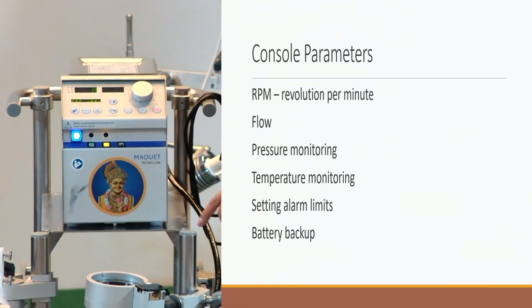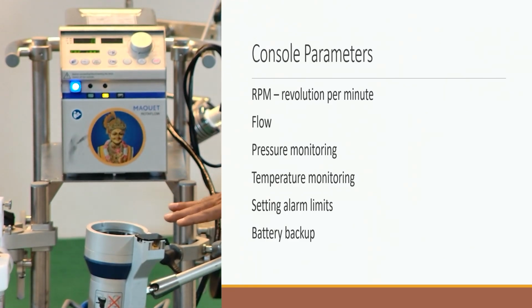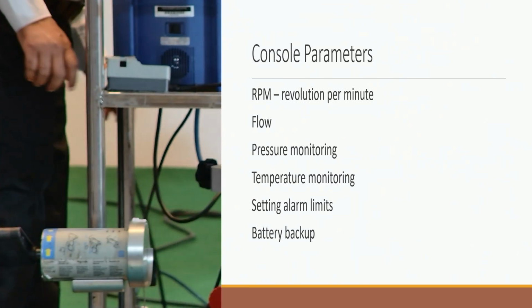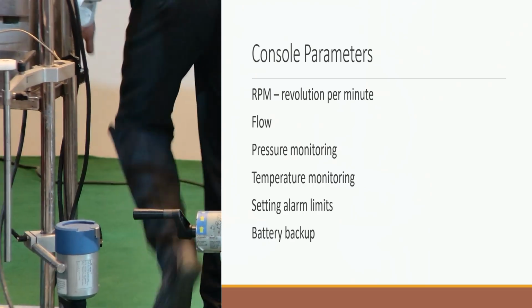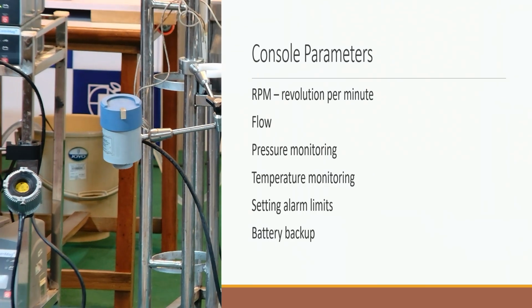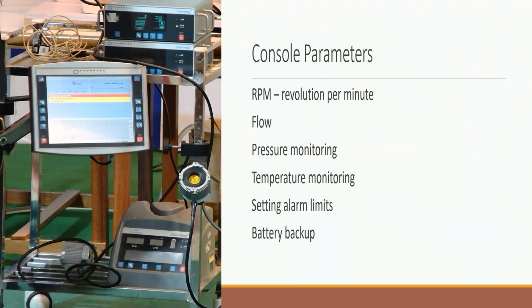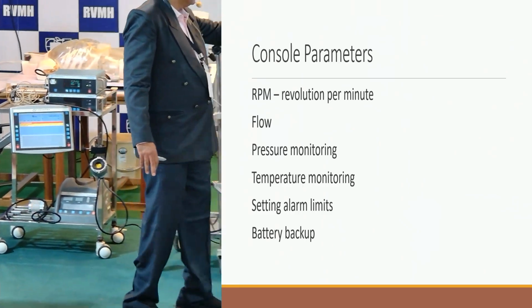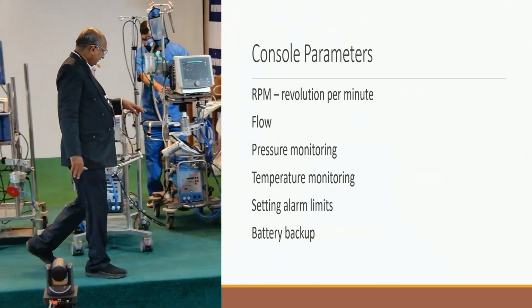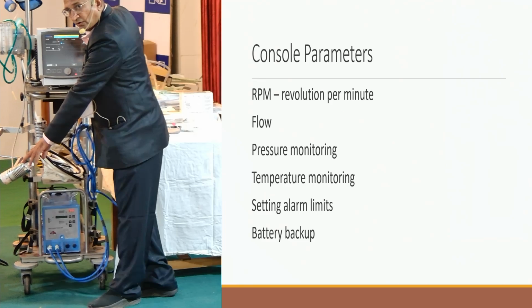This is the external motor drive of Maquet. This is the external motor drive of Medtronic. Similarly, you have a Sorin. This is the external motor drive of the Sorin machine. This is Centrimag, and this is the external motor drive of Centrimag. And the last one is Medos. This is Medos, and this is the external motor drive of Medos.